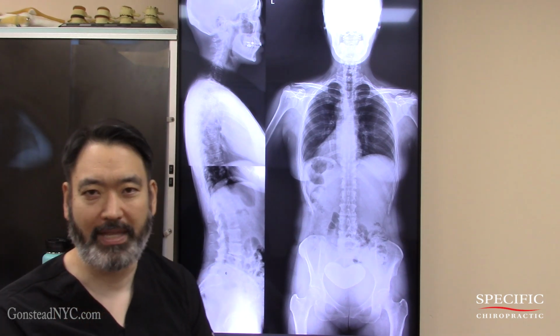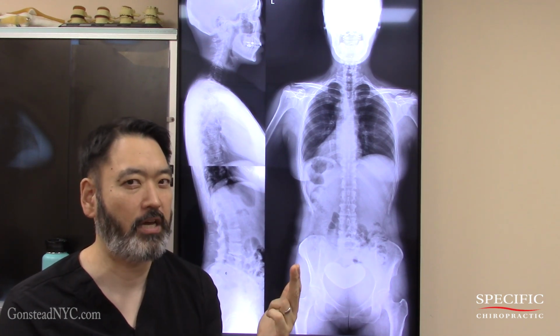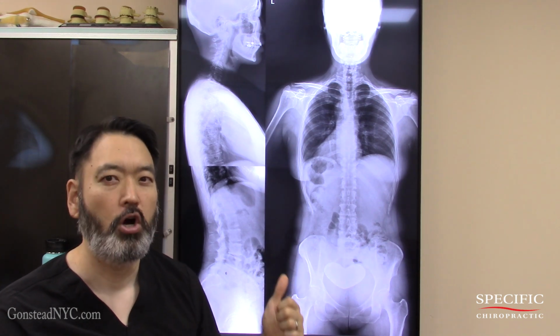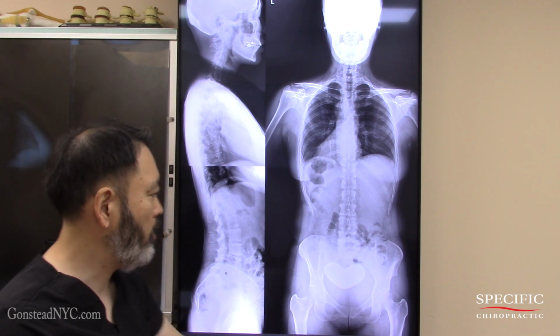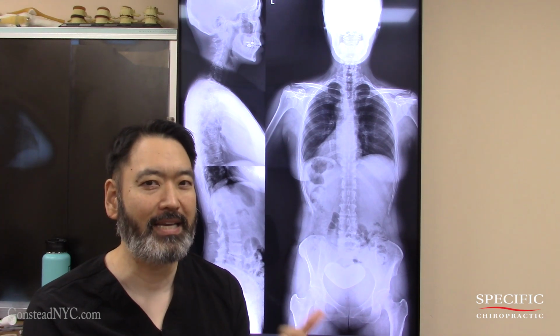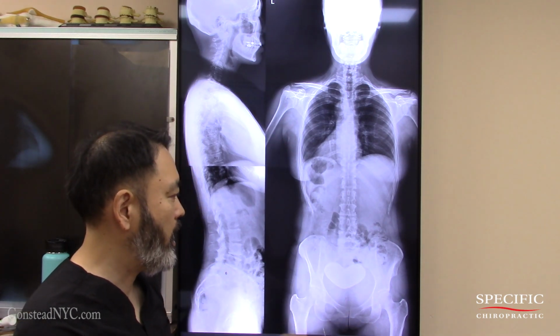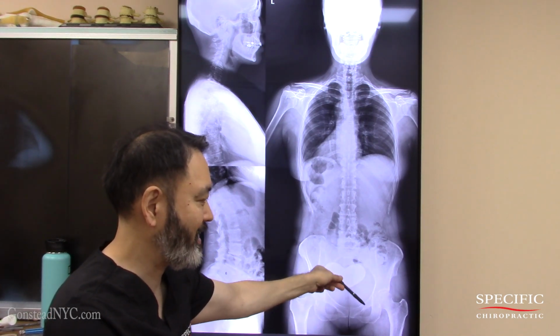What are the potential causes of that? There's got to be an AS-IN misalignment of the ilium, or it could be a posterior rotated sacrum, or a sacral segment issue. What can make it go forward? Potentially, a PI-EX or PI-IN ilium. Now let's take a look at the AP. How's it leveled? The femoral acetabular line is sinking down this way.